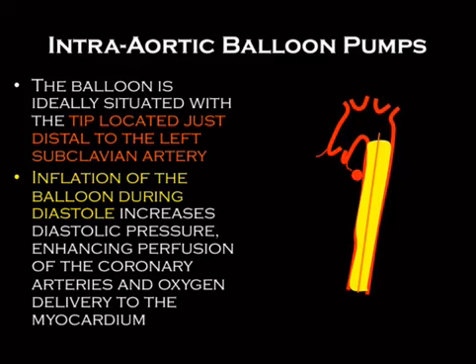So it's inflating as the heart beats during diastole. It's not inflated the entire time, it's periodically inflating, and the purpose is to help drive blood back in through the coronaries. The thing you need to remember, though, as a radiologist, is where it's positioned, and it should be positioned distal to the takeoff of the left subclavian artery.